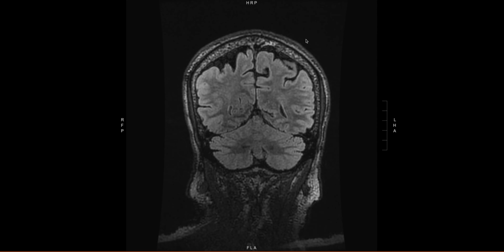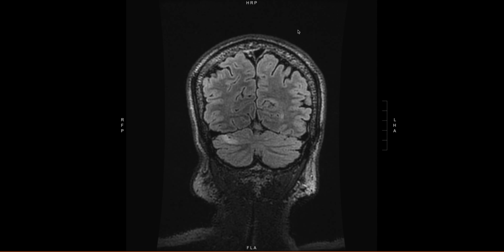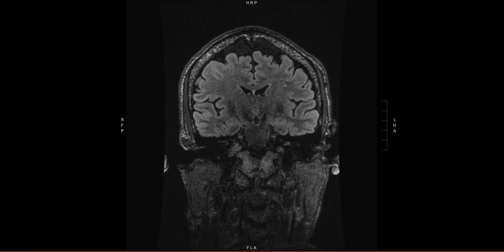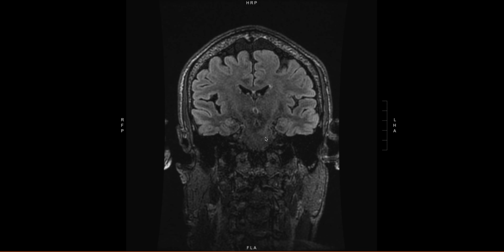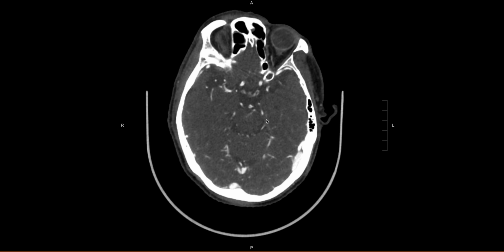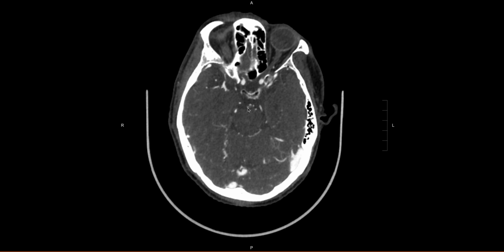And the FLAIR, just to go through, we'll see there's varying ages of different FLAIR signal. We still don't have too much FLAIR signal for that brainstem infarct, but the point is it's infarcted, and the patient will have a permanent neurodeficit as a result. So this is a scary case, subtle, no hyperdense vessel on the non-con, but that's not 100%. And you really, in this case, want to look at that axial very closely to notice that filling defect.